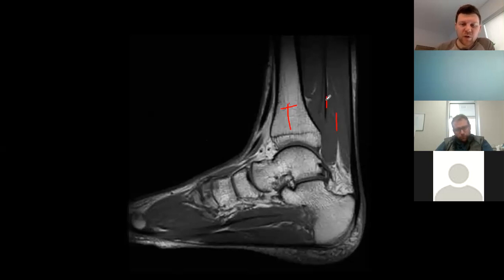And sometimes if we're describing something different, like a mass or even whatever's back here, which someone's going to answer in a second, this tissue is isointense to the tibia, meaning that it's a high fat content on this T1. So if you are identifying a soft tissue mass or a cyst or a lesion or something like that, isointense can allow you to identify what the material is because it has the same signal intensity as something else.